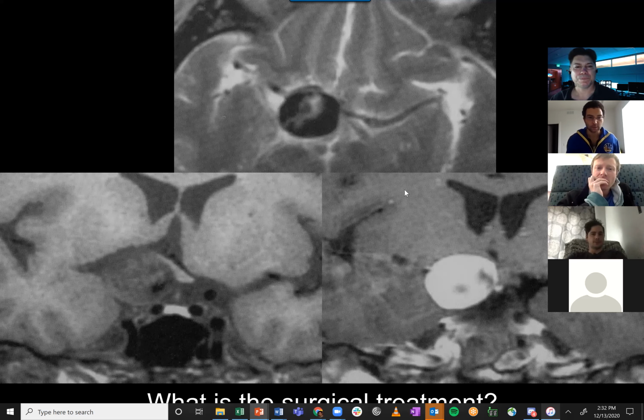That's right. This can either be done endovascularly with coils, but I think with one this big, you don't want to risk that. I think this would be a frontal temporal craniotomy. So you can actually see the flow void of the supraclinoid ICA right in the middle of this thing. And sometimes you get this phase encoding chatter. You get a little bit of artifact that goes kind of right to left in the phase encoding direction from that enhancing lesion. Very dark on the T2. So that's a great appearance for an aneurysm at that site.